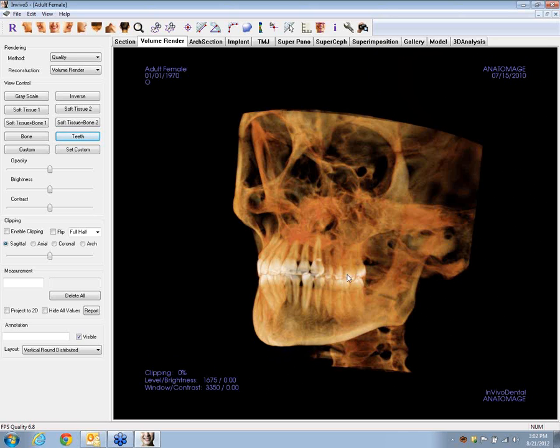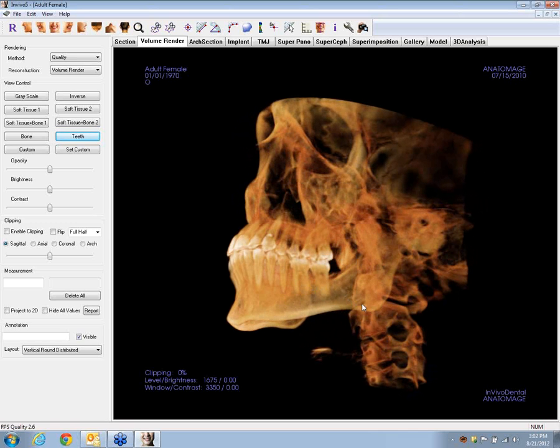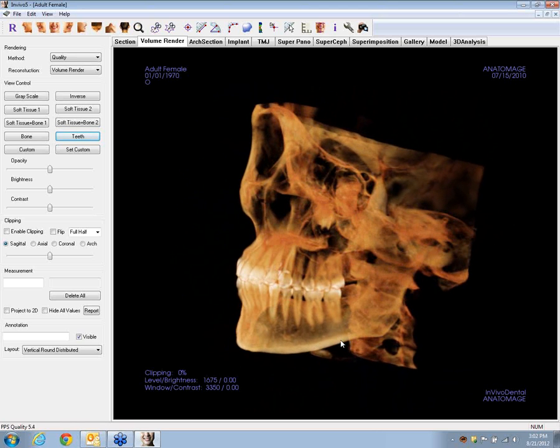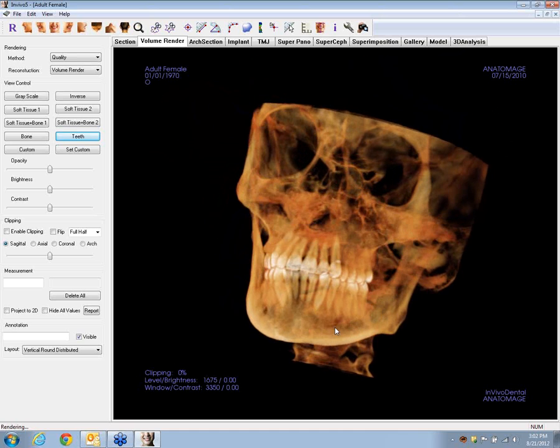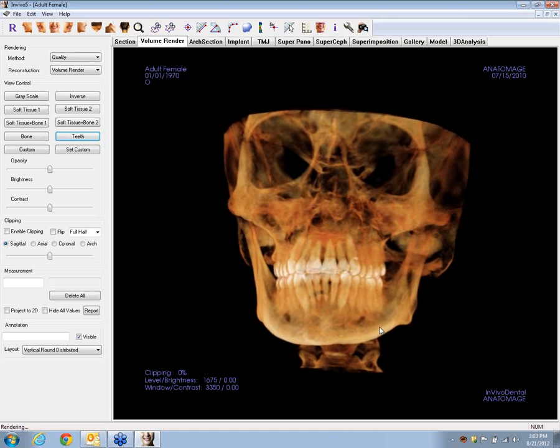This is a completely intuitive thing. When you take a look at this volume render, you can immediately tell what's dense and what's not. Your patients intuitively know when they take a look at this what it represents. You know, what is strong stuff and what is not so strong. And so this tooth render option is really a strong one for presenting to the patient.